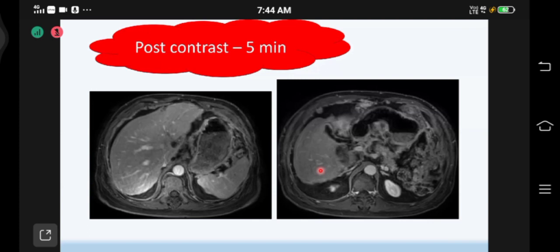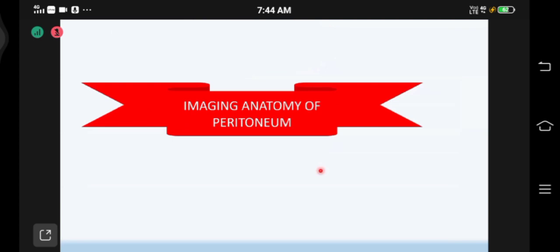So this is about the third, that is, dynamic post contrast. So these three become the most important imaging sequences, but we always add a coronal plane of T2 IRFSE sequence to it to make it a complete protocol.